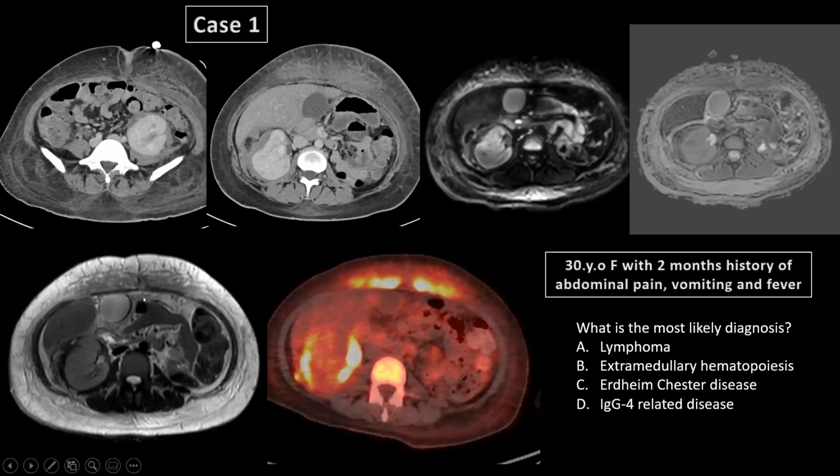However, if you can see here the bone marrow in the T2 weighted images, it's of normal signal intensity. It's not low, as we would consider in the presence of anemia or a myeloproliferative disease. So it could be one of the differential diagnoses, but it's less likely.